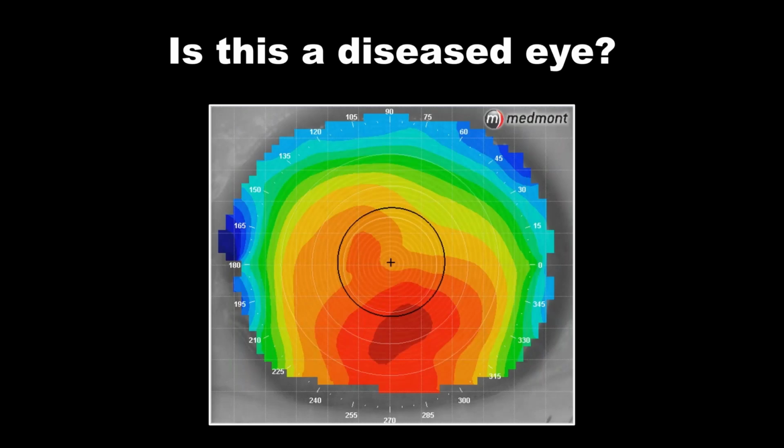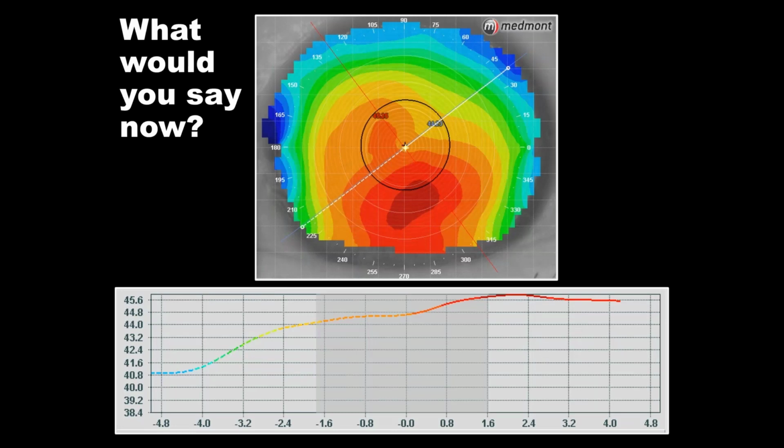Now here's the first case, and I might ask you, is this a diseased eye? And I'd look at that topography and I'd say that looks like a pretty droopy corneal apex. It's pretty steep relative to the superior cornea. Is that a diseased cornea, or is it just a droopy corneal apex? So could you say at this point, just looking at that topography, that you could definitively say it's diseased or not diseased? Well, we're going to need more than just the topography. We don't have any reference point. We don't have any radii, as an example, to draw any conclusions from.